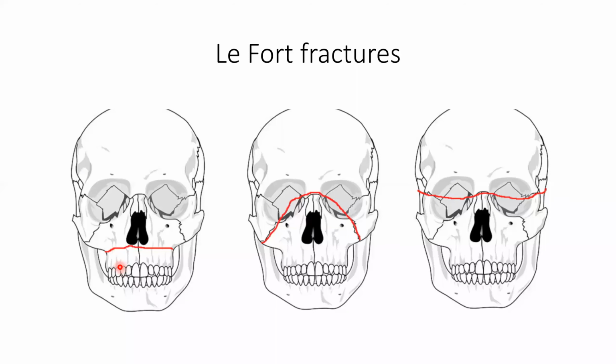So this fracture of the face is horizontal and involves only the maxilla. Okay, so this is type 1. And then there is type 2, which involves the orbit and nose and the rest of the structure. The type 1 is the least severe and the type 3 is the most severe. The type 3, you can see, involves this portion of the face.